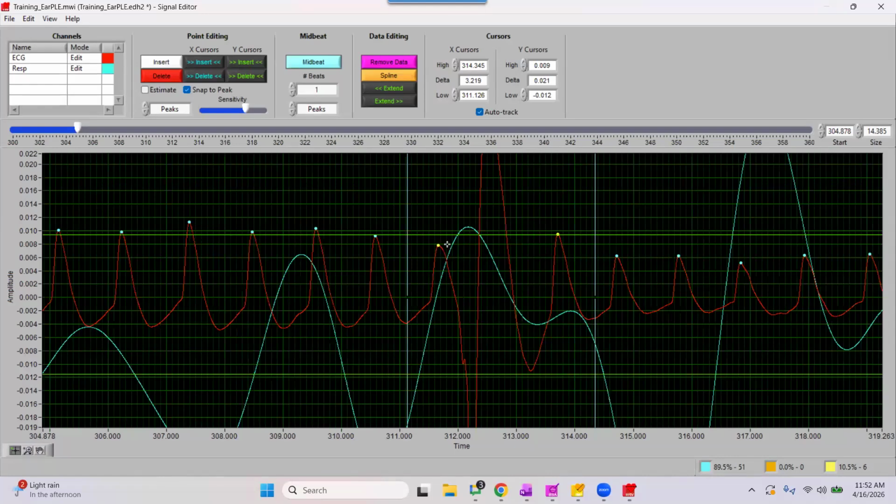So based on this participant's pulse to pulse interval, when we use these blue X cursors to define our anchoring points and the time difference between the two, we're able to have the program determine how many beats should have been within this section of data that were missed.